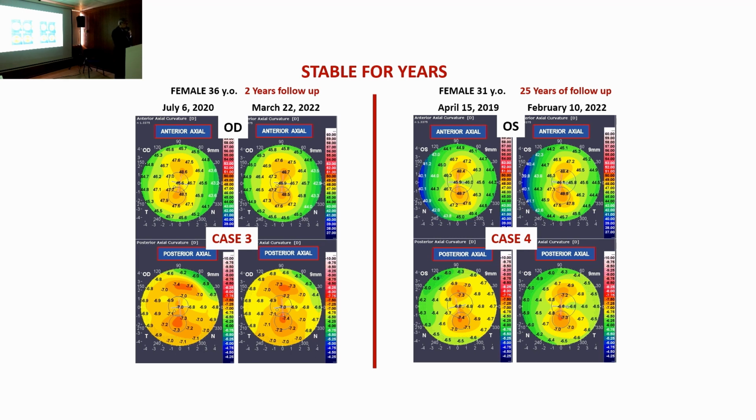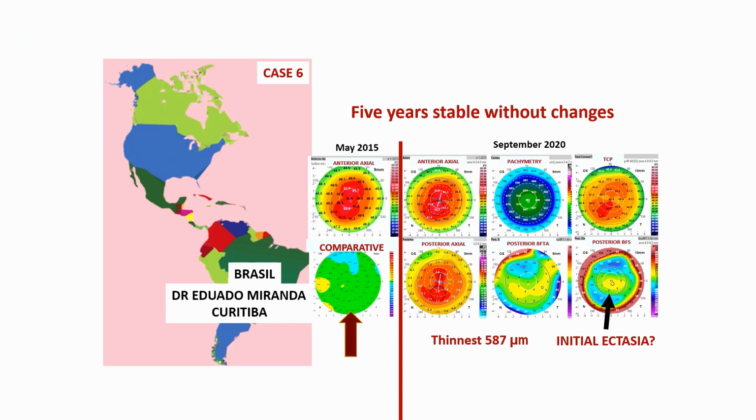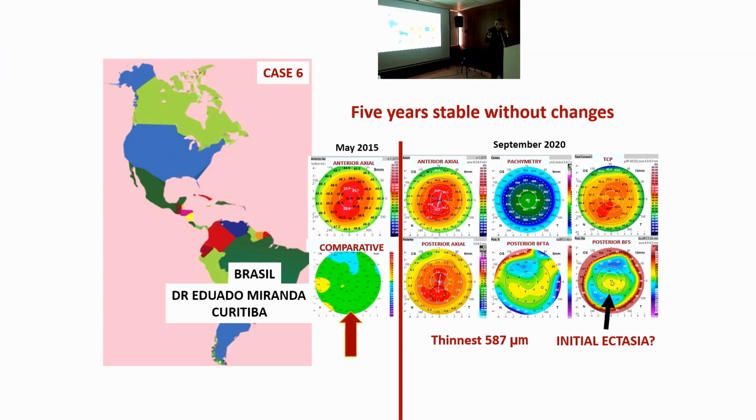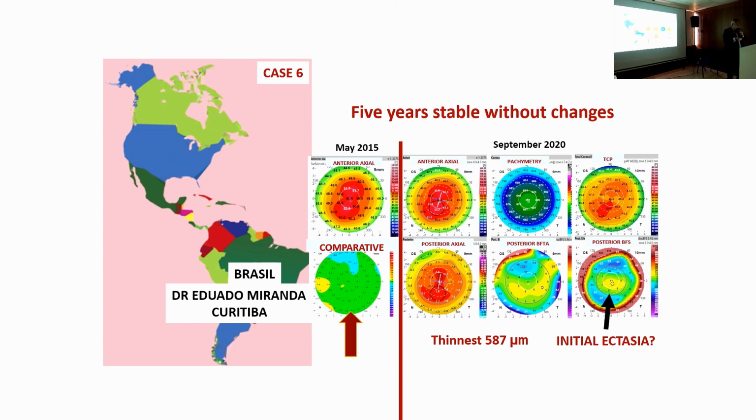We reduce the anisometropy tremendously. So I put this in a group of Galilei, and I began to receive more cases from different places. Nobody will discuss this about keratoconus. This red will say keratoconus with any other device, but look at the pachymetry. It's a very thick pachymetry, okay?